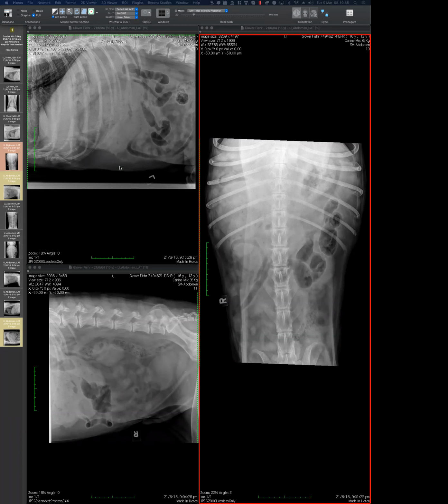I don't like the appearance of the intestines. I feel like there's two populations of small bowel, or the cecal area might be displaced from the right to the left side, and I can see colon where it's descending, but I can't see the transverse colon. And if the accumulation of gas is the transverse colon, it's not in a straight line. It looks quite plicated, well, bumpy, and not where I would expect to see it.